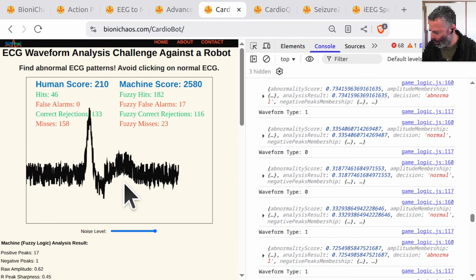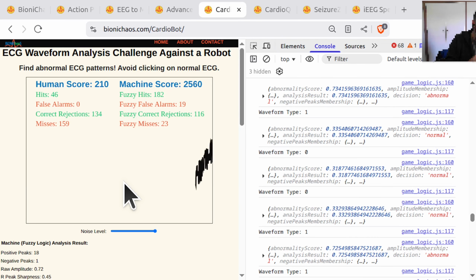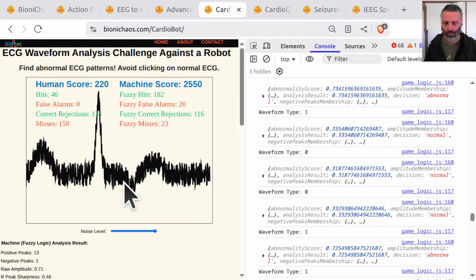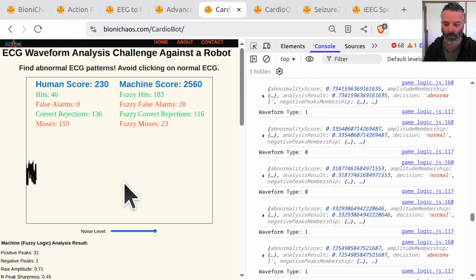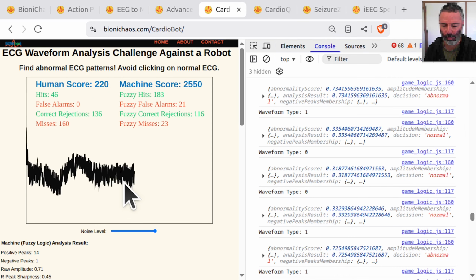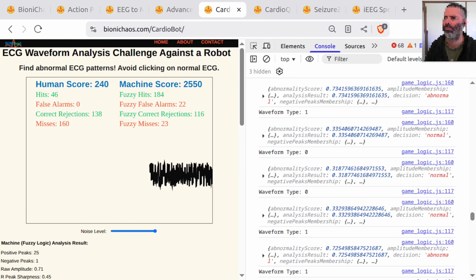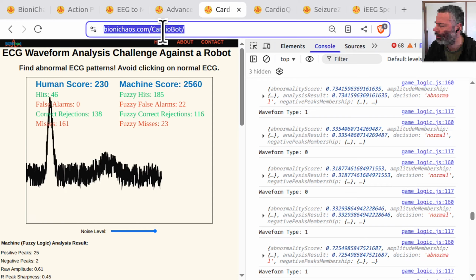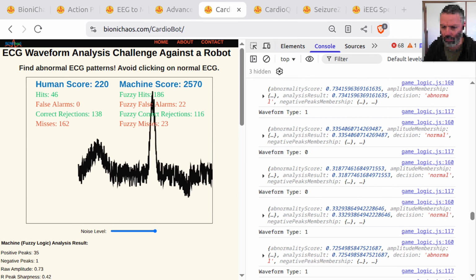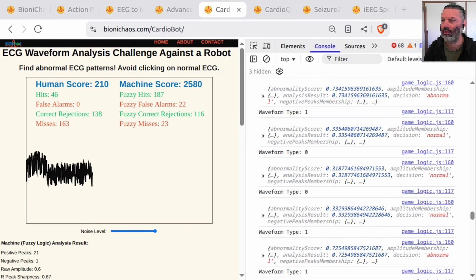Where's the main obstacle? There are two critical areas where Python and a backend shine, and trying to move them to vanilla JavaScript is a major performance and complexity risk. Challenge 1. The signal processing core. Look at the ECG processing.py file. It relies heavily on NumPy for efficient array math, and most critically, scipy.signal for the peak detection, specifically the find peaks function. Ah, the part that finds the mountains and valleys.